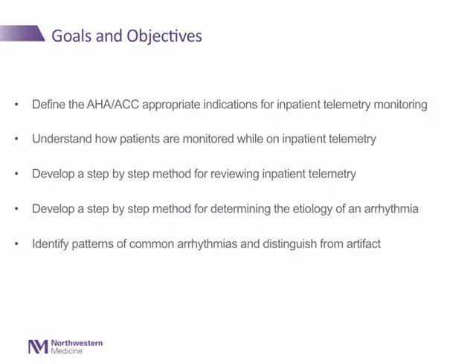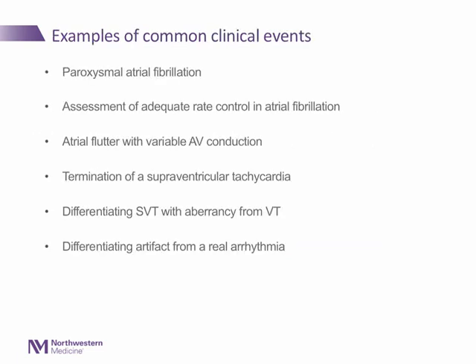We will now conclude by helping the viewer to identify common clinical arrhythmias as well as to determine when artifact is being misinterpreted as an arrhythmia. The following list, while not exhaustive, represents very common clinical events that are diagnosed through proper use of telemetry.